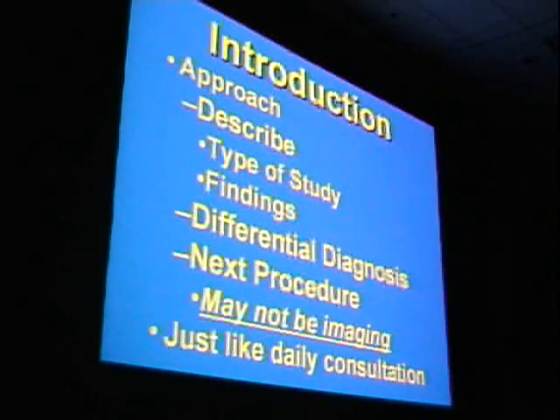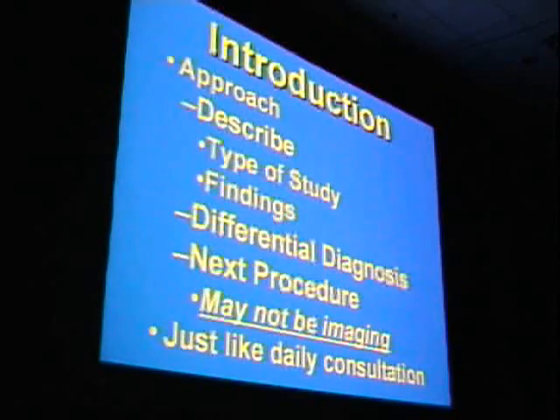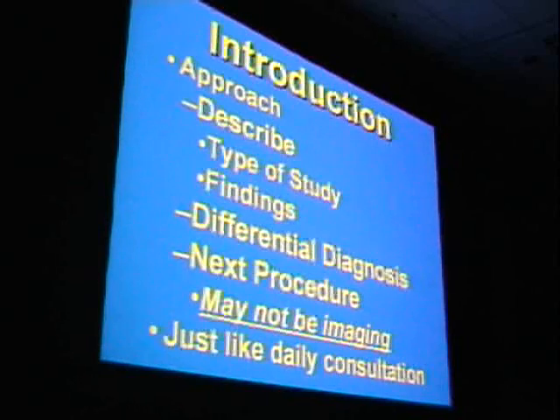So very simply, what you see, and I also think it's very important to tell the examiner what kind of examination it is. A plain film, an esophagram, a contrast-enhanced CT with oral contrast, etc. Describe the findings, and quite frankly, I even say how many images I'm looking at. Describe the findings, provide a differential diagnosis, and then consider what you might do next for the patient.